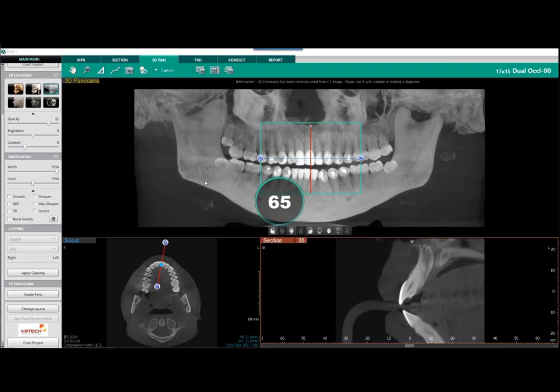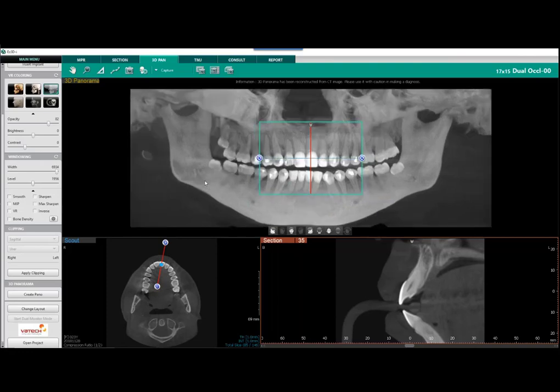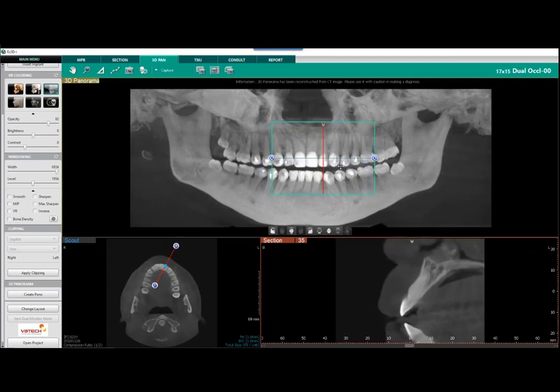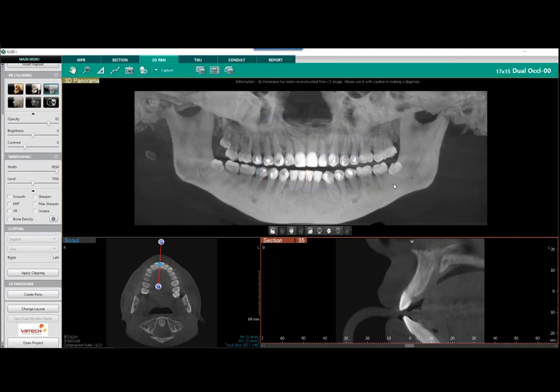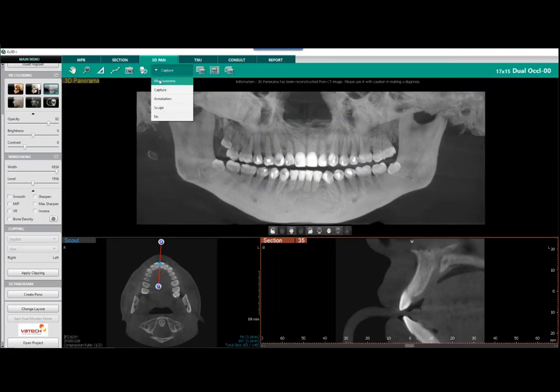Well, this might be a good time to talk about some of our clipping or our camera tools and options. So see how my screen kind of regenerated there? I'm going to go ahead and scroll the wheel on the mouse, and you had talked about hitting the space bar. Let's go ahead and hit our space bar here. Toggles that off, toggles that on. Paul, do you want to kind of talk about some of our capture tools within the software?